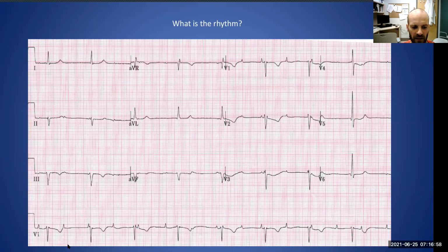With a second degree AV block, you might see a 2-to-1 pattern, but in that case there'd be a fixed PR interval with half of the beats. Whereas here, the P waves and the QRS complexes are going at completely separate rates. The final thing is that if you've got a second degree AV block, if you're dropping a beat, then you'd expect to see a repeating pattern that is irregular with the QRS complexes.